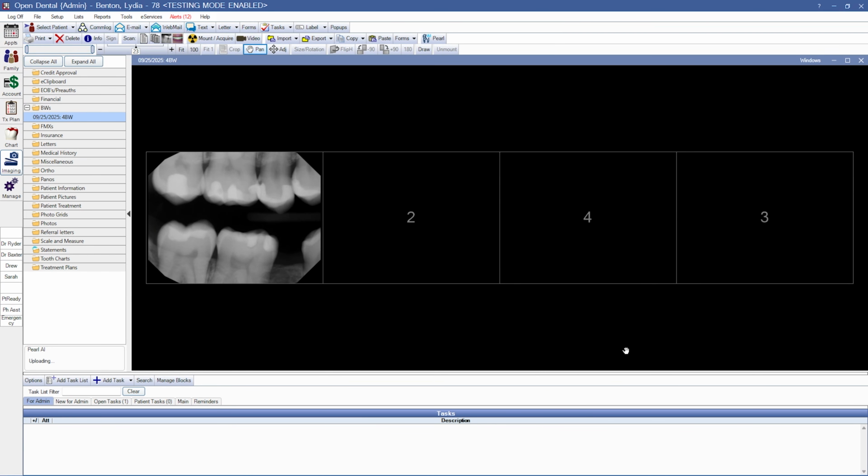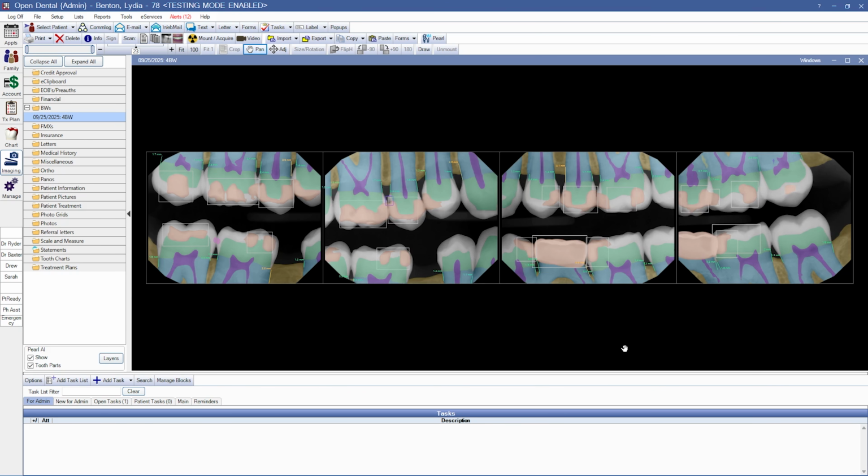Once you've brought the image into one of the folders that has been marked for the automation with Pearl, we'll automatically start making annotations. To bring in additional images, simply continue with your sensor. All of the images brought into the specific folders that you've indicated will start making annotations on the images.